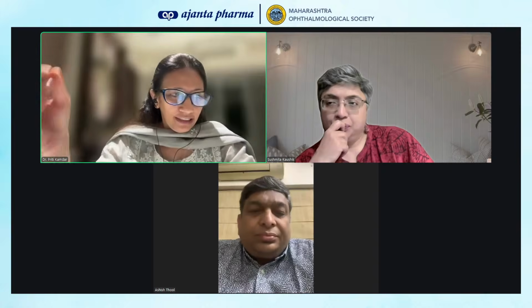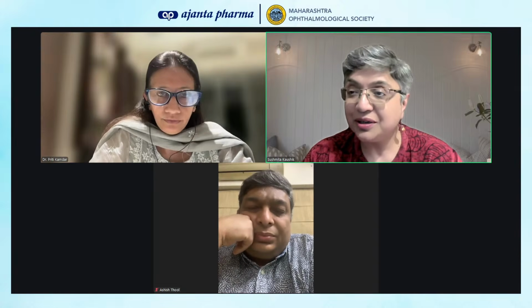Dr. Sushmita, if you can just say what is red disease, define it, and how do you recognize it? Red disease. The OCT, especially the Cirrus, has about 350 Caucasian adult eyes as a normative database. So when something is flagged in red, it only means that the thickness of that particular patient is seen in less than 1% of those normative people, but they are normal. Even though it is in red, it only means that it is seen in less than 1% of that normative database.